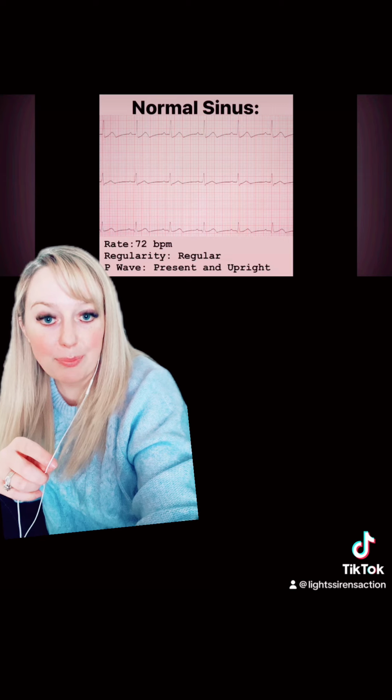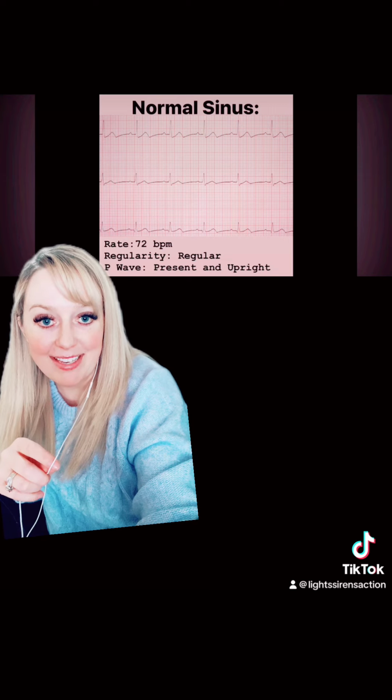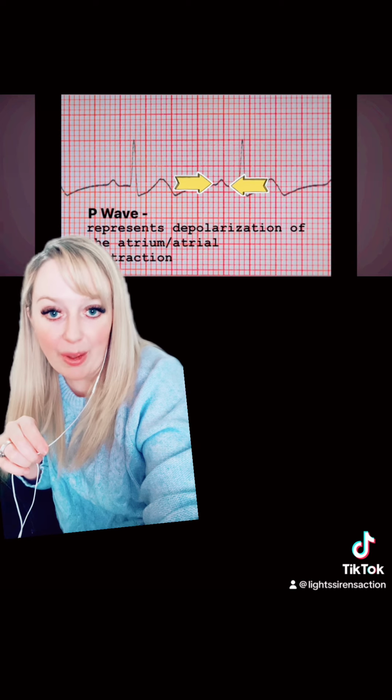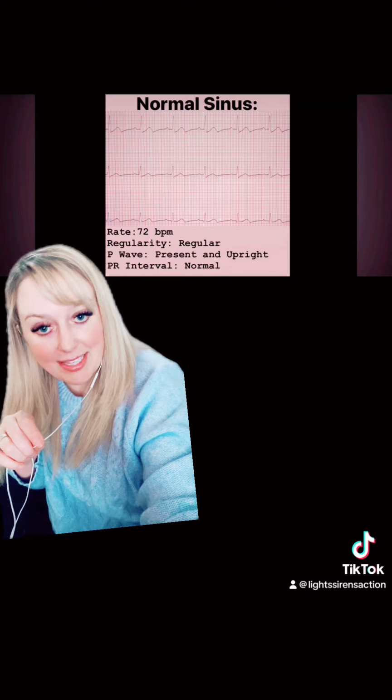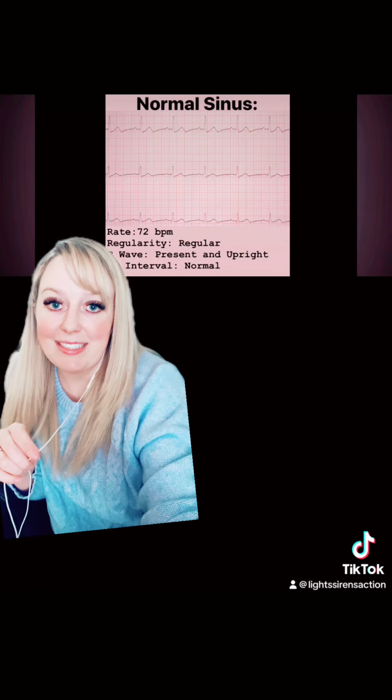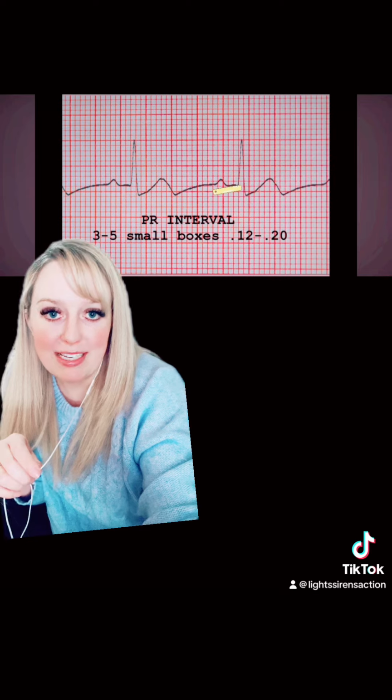Are the P waves present and upright? From what I can see, they are present and upright. And just a quick reminder, the P wave represents the depolarization of the atria, which is just a fancy way of saying that that little wave right there represents when the top chambers of the heart contract. Next thing we want to check out is the PR interval. It appears to be normal, but let's take a closer look. I wish we could zoom in, I'm so sorry, but yes, it is 3 to 5 small boxes.